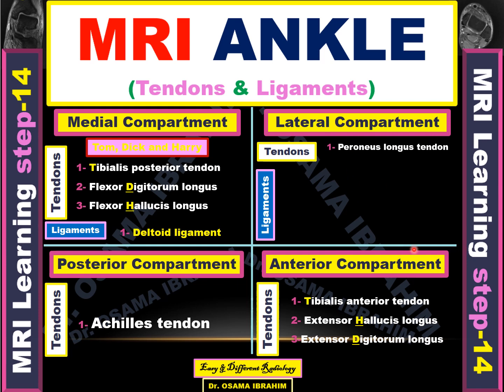And now the lateral compartment shows two tendons only, the peroneus longus tendon and the peroneus brevis tendon. Peroneus longus is lateral and the peroneus brevis is medial.